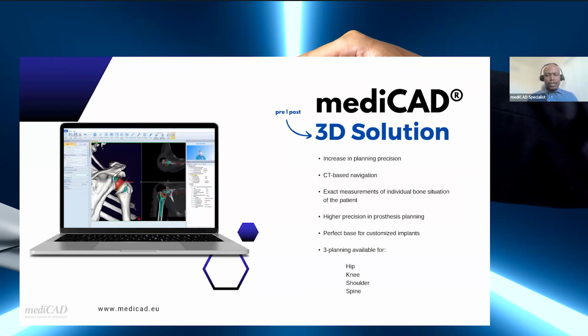With the mediCAD 3D solution, the orthopedic surgeon can analyze patient anatomy and plan surgery in ways not possible with traditional 2D imaging. Complex cases can be addressed more effectively with a personalized surgery plan tailored to each patient's needs. The 3D software allows surgeons to simulate different surgical scenarios, helping to reduce stress, save time, and minimize intraoperative risk.